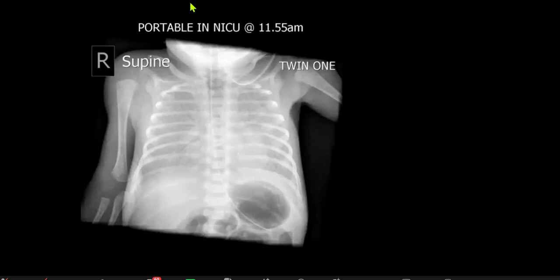So this is the frontal chest radiograph of a neonate. The lungs appear of normal to slightly reduced volume, and there are bilateral, diffuse, extensive granular opacifications throughout both lung fields. My primary differential for this, especially if the patient is a preterm baby, would be respiratory distress syndrome.